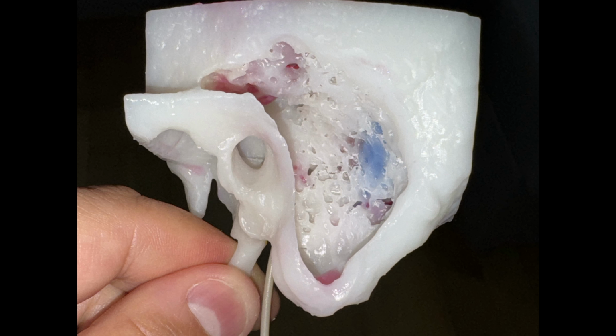In conclusion, this is the whole process from start to finish. You can take a patient CT scan, you can make a 3D model using ITK Snap, smooth that model in Meshlab, print it in your preferred slicer. I think that resin printers are better than filament printers. I've tried both and I have a video about that.